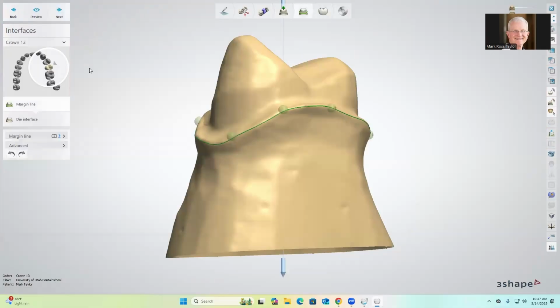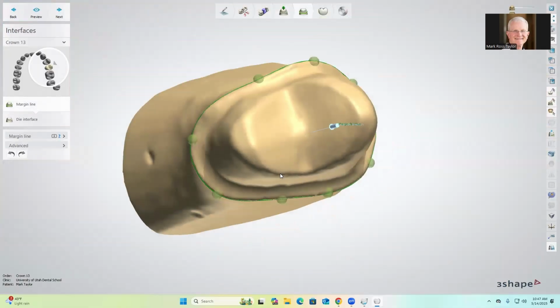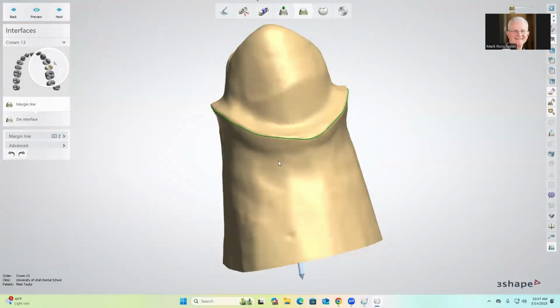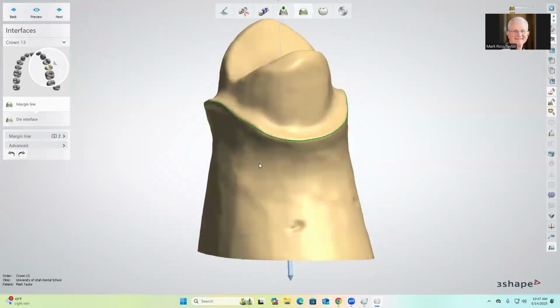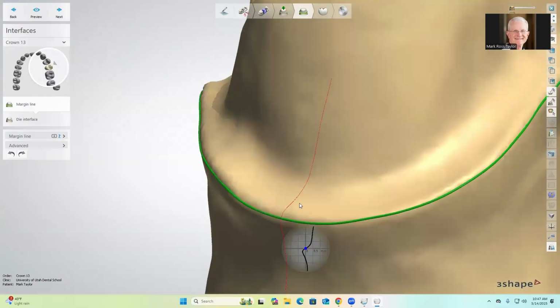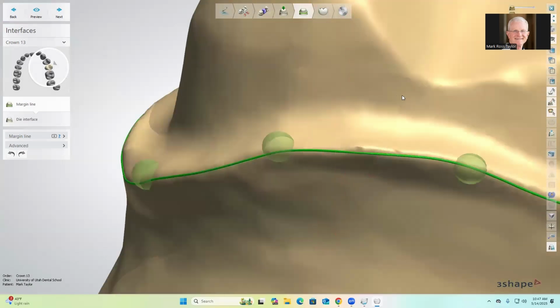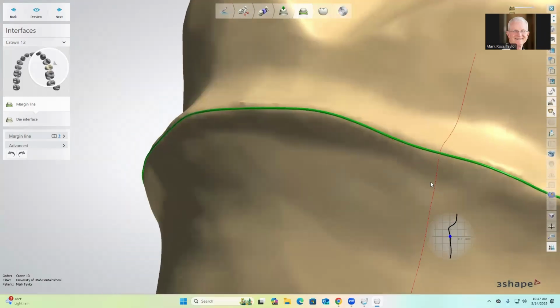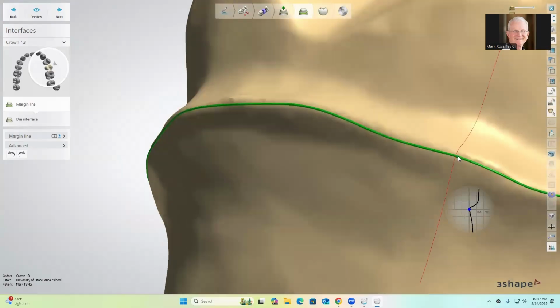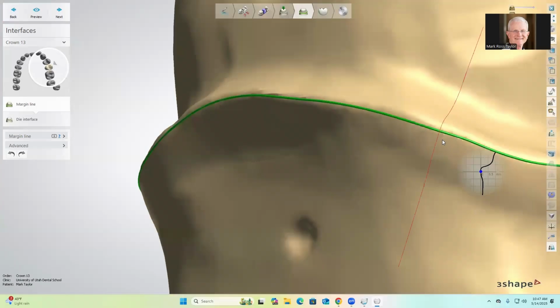Now this is where it's going to put your margin on. And you can actually see where it takes off the rest of the model, and it's just giving you where that margin is, what the computer thinks the margin is. If your margin's nice and sharp, everything should be right in here. And you can kind of see how you get this little line right here of light. Your margin's going to be right below that. And right now, you can see right where that margin is.